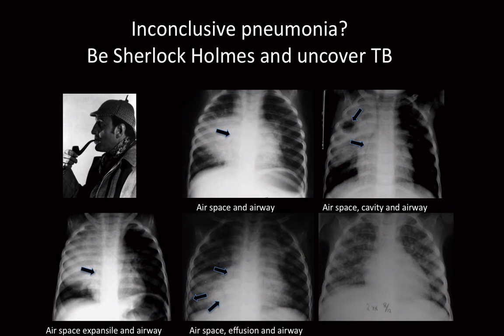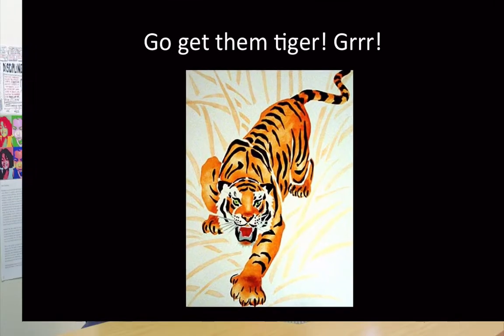And my last picture of the day is, TB isn't just made with lymphadenopathy, which I've led you to believe. If you see bilateral nodules, much like stars in the sky, that's miliary TB. You're probably right making the diagnosis in these conditions too. So that's it for the AP chest radiograph.